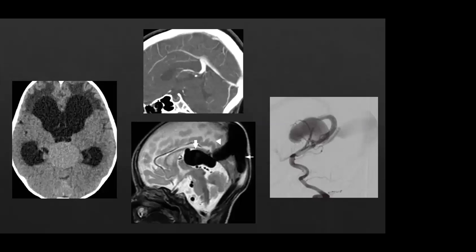Vein of Galen, of course, it won't be complete to discuss that without showing this example of vein of Galen malformation, which is a pediatric abnormality. Typically, it's a vascular malformation at the level of the vein of Galen, which is an AVM, and you can get fistulous components. So this is what we are seeing in this patient over here. Here you can see injection into the vertebral artery with the choroidal vessels, which are then fistulating into this aneurysmal dilatation of vein of Galen, which we are seeing here on the sagittal T2 sequence.